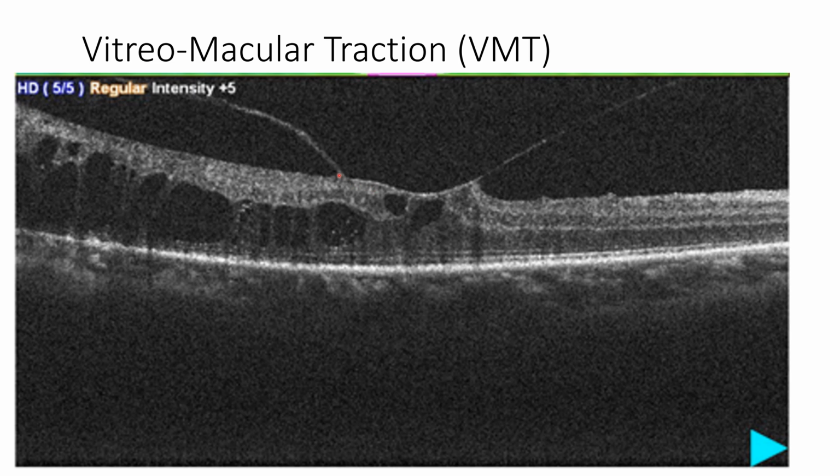So there will always be two ends of this membrane which are causing the pull, and the portion which is attached at the retina will be elevated in a tent-like fashion. And this distortion, when it is pulling the retina up, will create spaces in the retina causing tissue edema, which is passive, and also splitting of the retina.